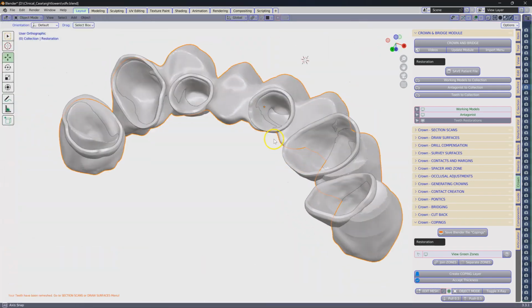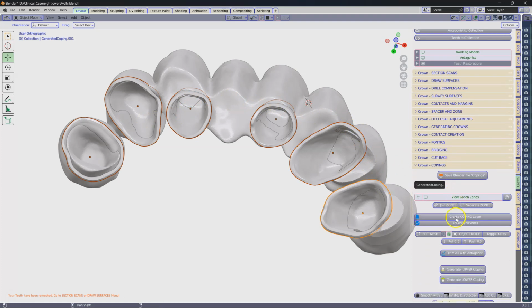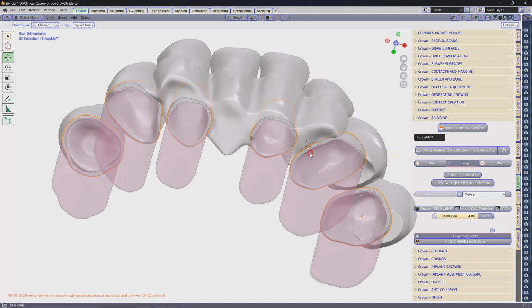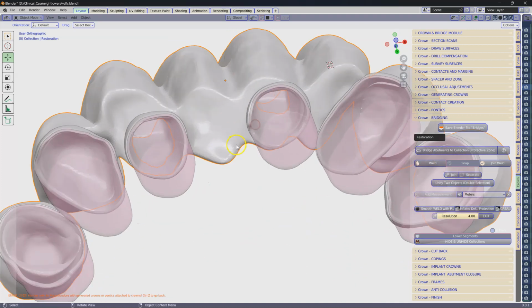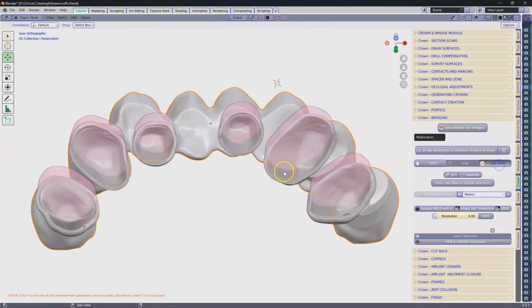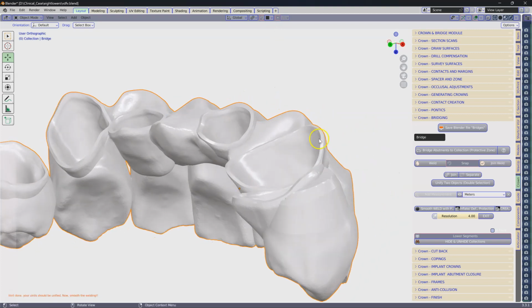There, that should do it. Now select your copings, only your copings, and you're going to put these into the bridge collection. So if it doesn't work the first time, click again. This is something I have to look at. This makes these cutting objects on the inside. Select your bridge and you'll see what happens next. So here, join weld. It's going to cut away the inside excess and then it'll join it to the copings. Like that. Now we've got some nice margins.